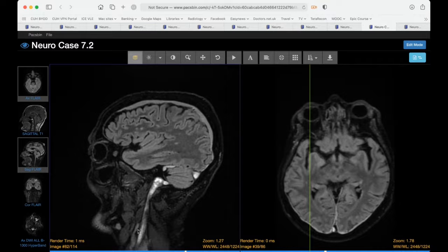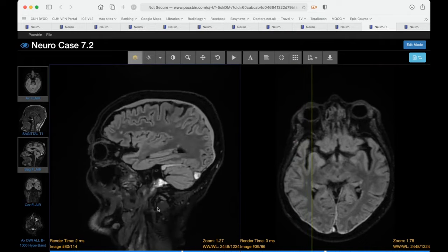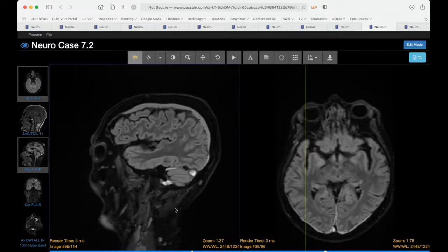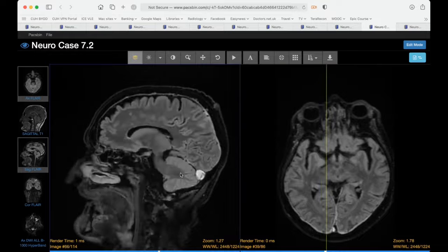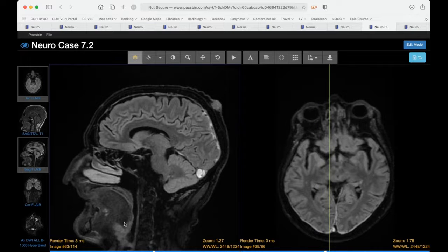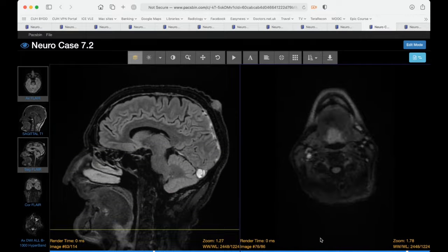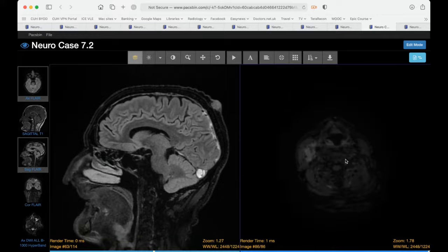At the bottom of the film there's some unusual T2 hyperintensity around the internal jugular vein. Then if you head back towards midline, notice something going on here at the tongue base. On the axials, you'll see what looks like a tongue base tumor, and probably, although we need more dedicated imaging to confirm, some lymphadenopathy.